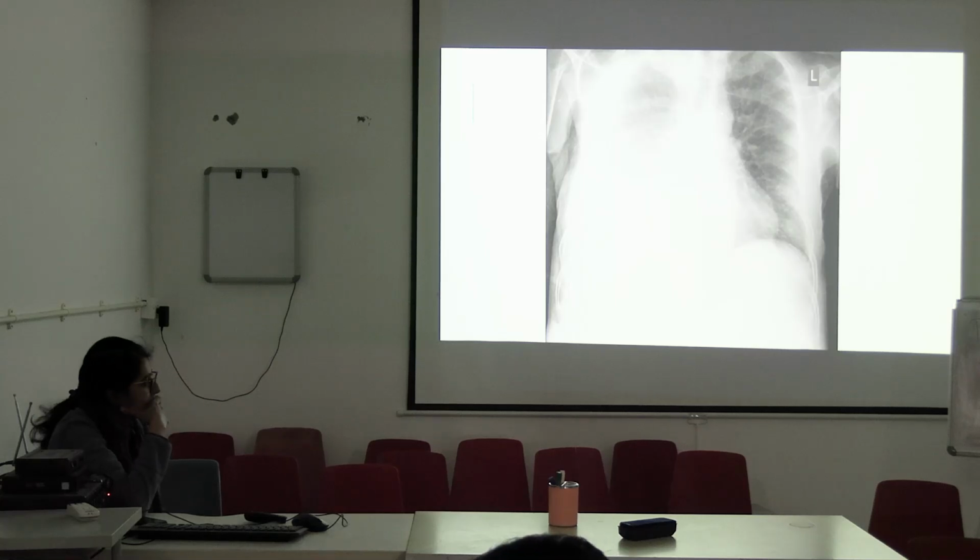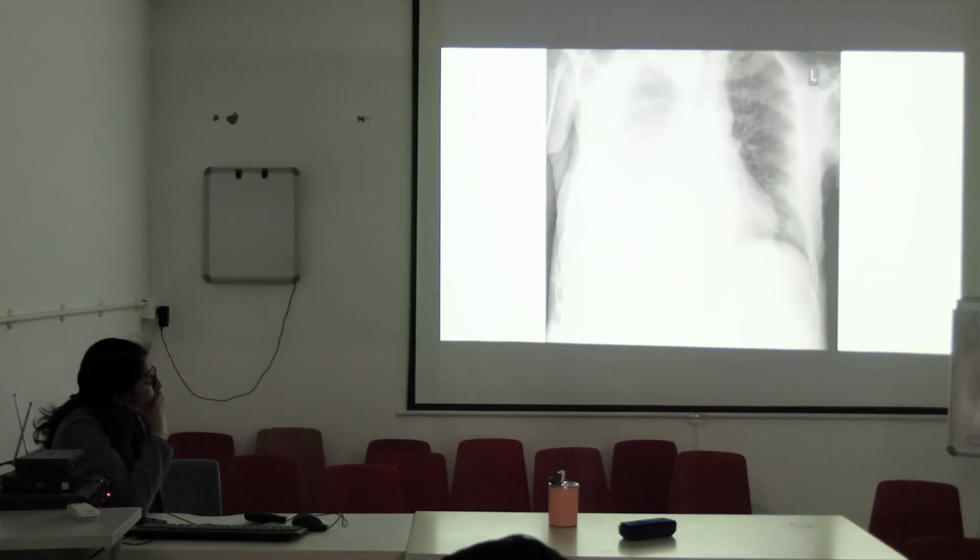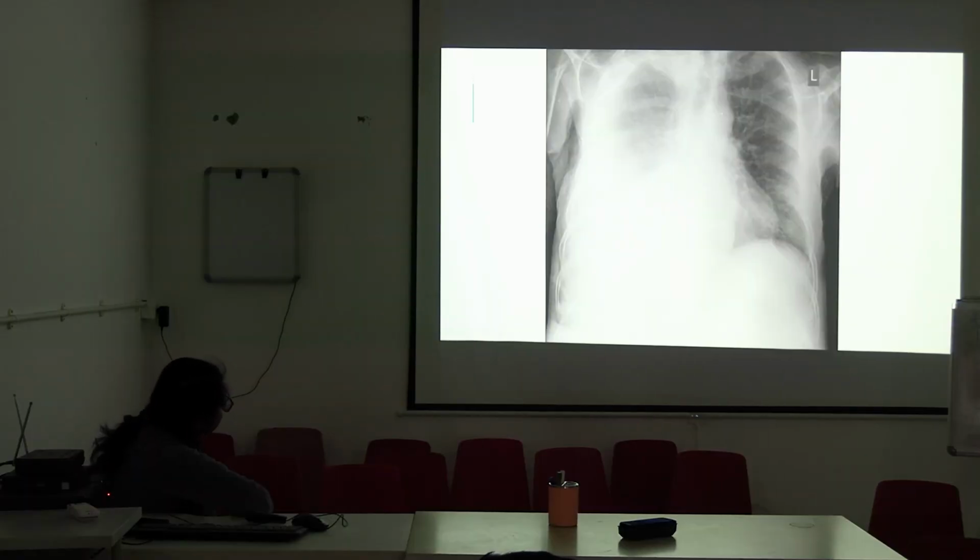Skiagram of the chest. Okay, thorax is okay. Okay, then there is a dense homogeneous opacity in the right. Which zones? Middle and lower zone of the lung. Comment on the costophrenic angle, right costophrenic angle. There is obliteration of the right costophrenic angle.